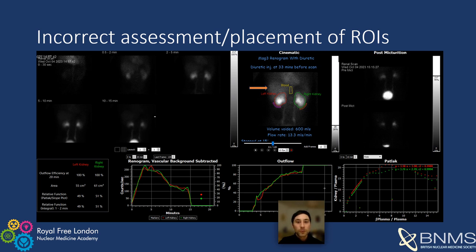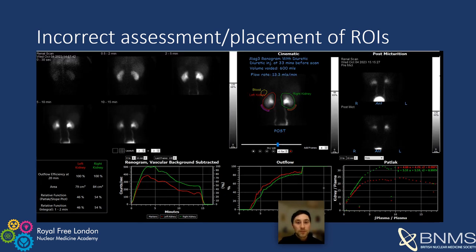As mentioned earlier, the liver should be avoided as MAG3 impurities are excreted via the hepatobiliary system. Please check for anatomical landmarks and select the correct posterior projection for native kidney scans. This is the correct image. The liver now appears in the correct position on the right-hand side of the posterior image.